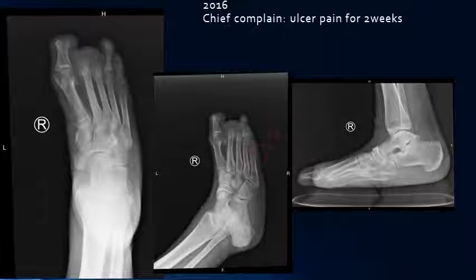In the doctor's findings were reported sclerosis involving the navicular bone and its articulation with the cuneiforms. Sclerosis, when describing a bone, is defined as a pathological thickening of the bone. Usually, one area of the bone will show this increase. In this report was also noted a healed oblique fracture of the distal shaft of the fifth metatarsal bone.